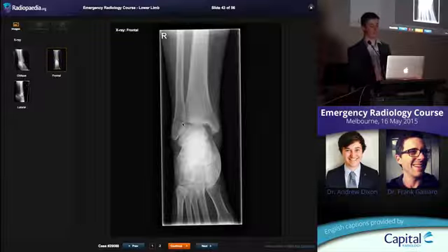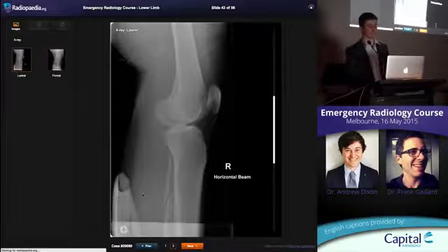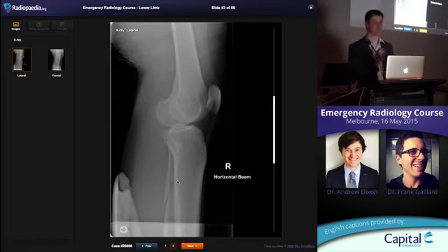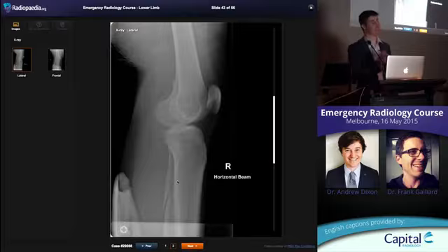And in this case where you can see one bit that's torn, but you can't see the other part of the ring that's been disrupted, you need to look proximally for it. Okay, so this patient, when you look at their knee radiograph, you can see a proximal fibular fracture. That pattern is called a Maisonneuve. I'm probably pronouncing it wrong, and there's lots of people watching this in France, so I apologise, but that's called a Maisonneuve. And that's a classic for radiology registrar exams. They love that one because you need to suggest the next test, which is the knee radiograph.